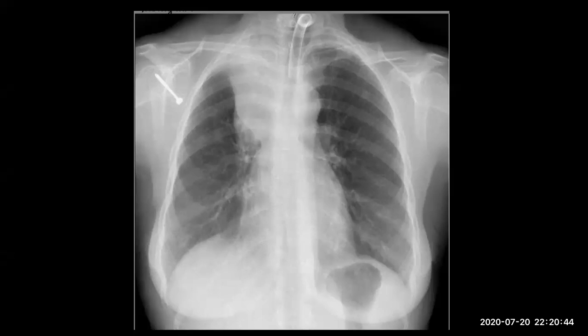Left upper lobe collapse. Right upper lobe collapse. What is the name of the sign? Golden S sign. Right, okay. Now you can describe the findings in a little bit more detail. This is a chest X-ray.